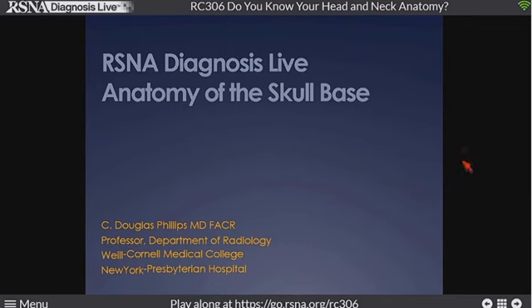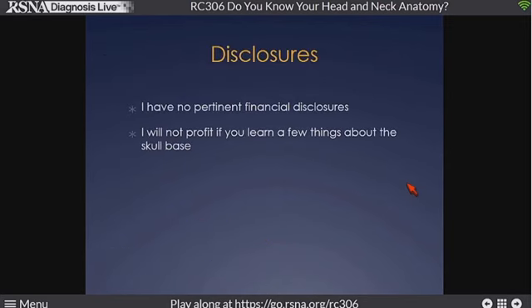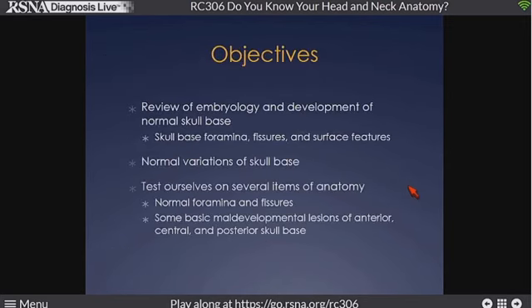Good. What I would like to do in the next 30 minutes is talk to you a little bit about the skull base. How many of you really like the skull base? Show of hands. Well, a few. Skull base is usually where people, when they're reading head CTs, kind of turn off, and it's where people reading necks kind of turn off because they're getting too close up to the brain. So for the next 30 minutes, let's concentrate on the skull base as if it is the most important piece of anatomy in the body. I have no pertinent financial disclosures, obviously not.